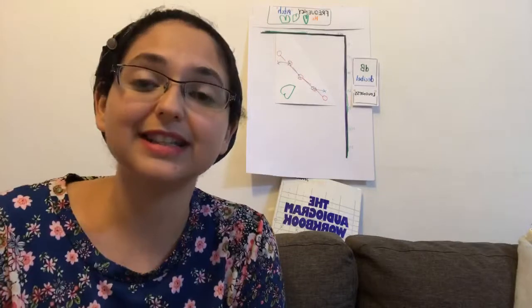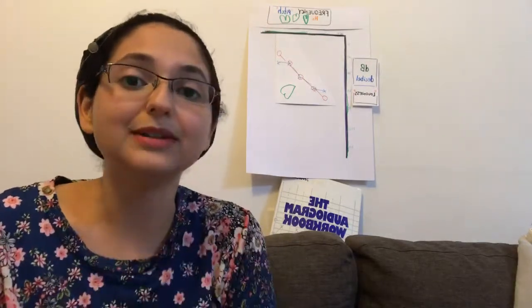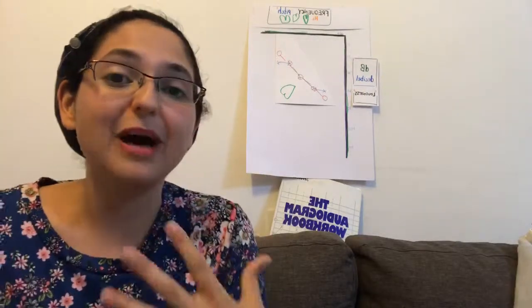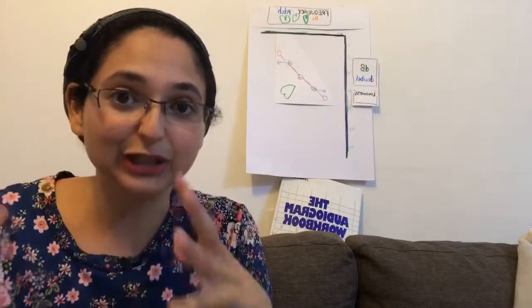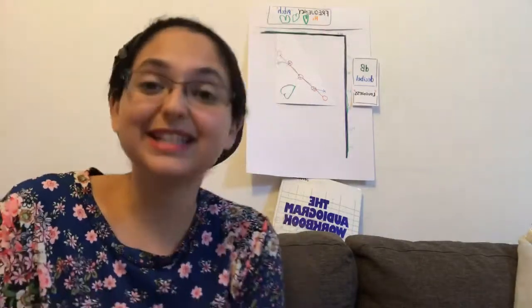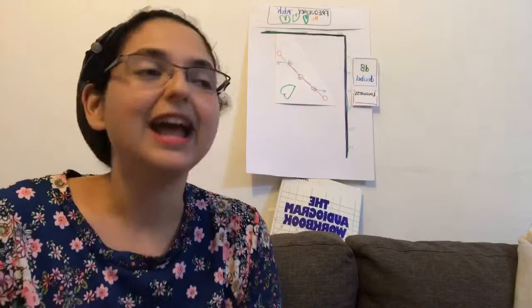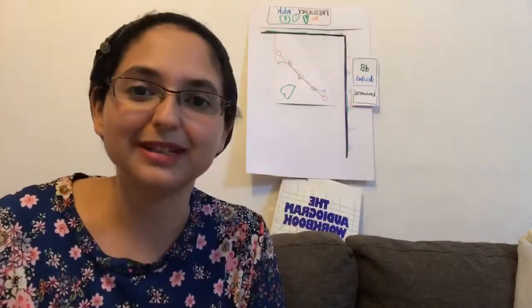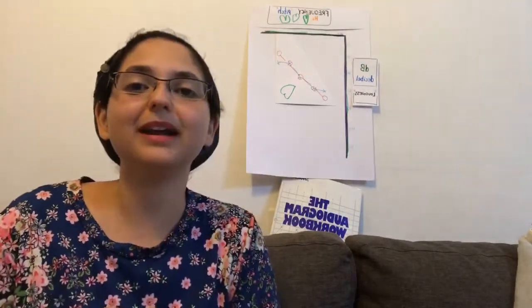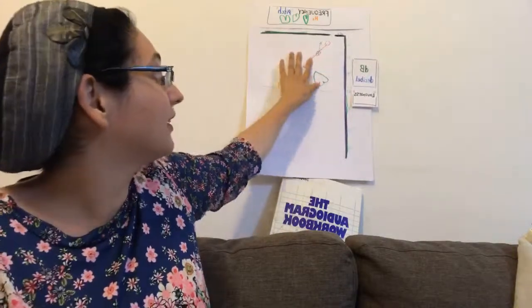And why this matters is because we have different sounds of speech. We have, for example, vowels, all the vowels are kind of lower frequency, lower pitch, whereas some of our consonants like the letter T, or the letter S, these have a much higher frequency for the sound. And when we're speaking, we're using all these sounds mixed up all together. But someone who has a high frequency hearing loss has a very common concern when their hearing loss looks like this, and they're hearing just fine.